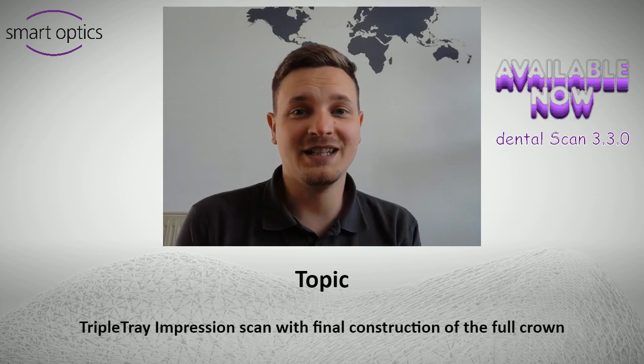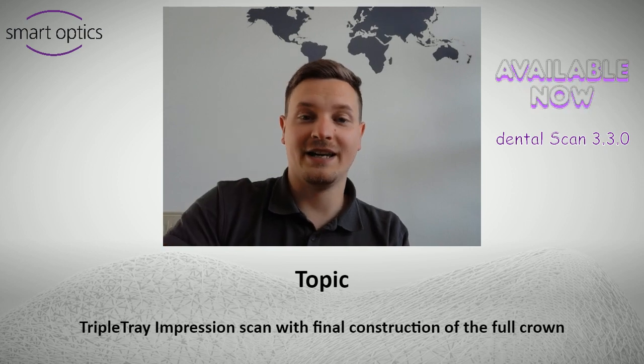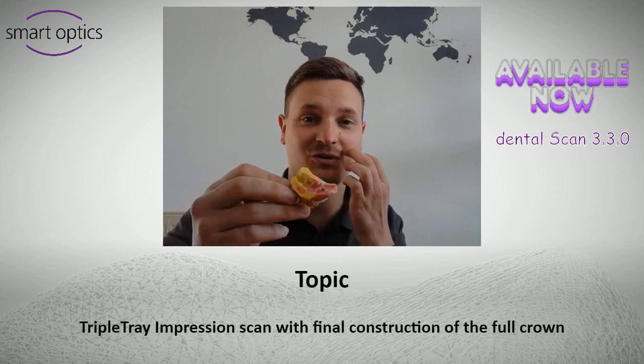My topic today is about scanning TripleTray impressions and the design of the crown afterwards, obviously.